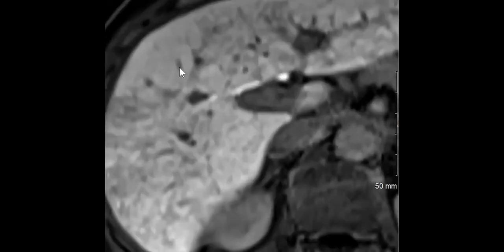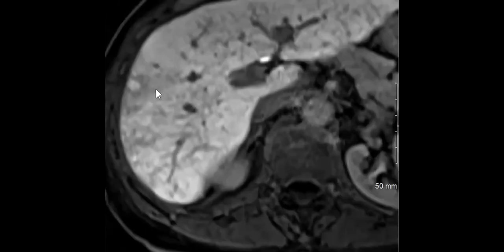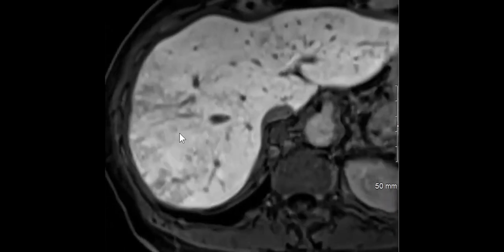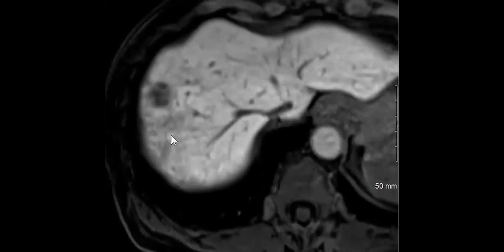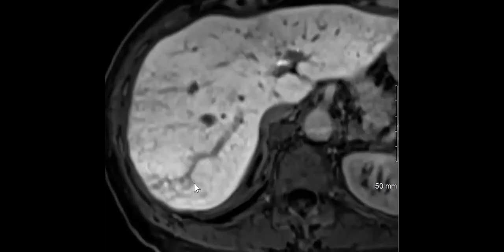and if you just focus on this part of the liver, this is what we expect the liver to look like in a healthy person, where you see the vessels as kind of black lines, but the background is uniform and hyper enhancing. In this patient, you can see that the parenchyma has a structure to it, has a texture to it. It has a very subtle reticular pattern to it. You see it? SOS. Yes.